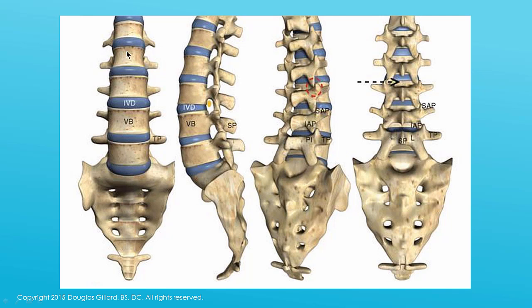Here's an AP view again of the cartoon. Here's a lateral view. In the lateral view, we can see the neural foramina, right? Or I guess we call them the intervertebral foramen. You can certainly call them the neural foramina. But the bottom line is these are the holes where the exiting spinal nerve roots leave the spine and then go off to supply every muscle in your leg, the skin, the blood vessels, everything. This is where the nerves communicate with the CNS. It's where the CNS meets the PNS through these neural foramina.